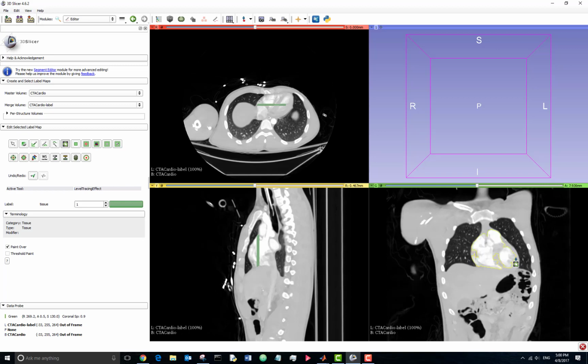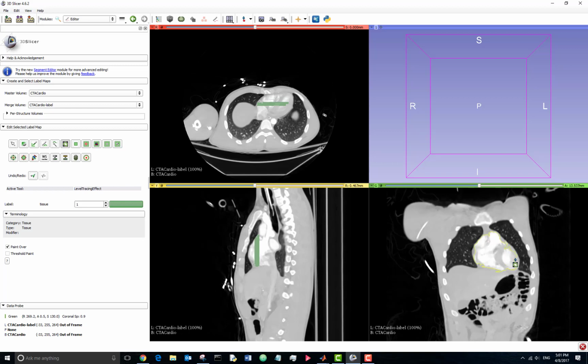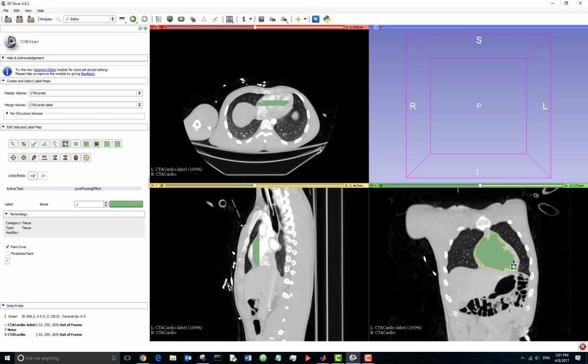Now you have to move the mouse a little bit to get a better scope of the selection. This tool memorizes the selection for the previous slice, so you have to move the mouse a little bit in order to adjust it to the new size. As you can see, when I'm scrolling through the slices, the heart is getting smaller, and you can see here.